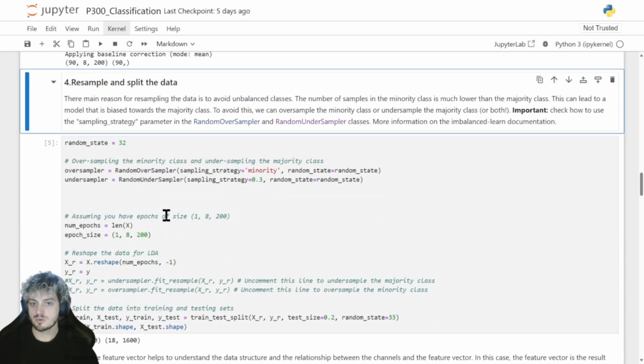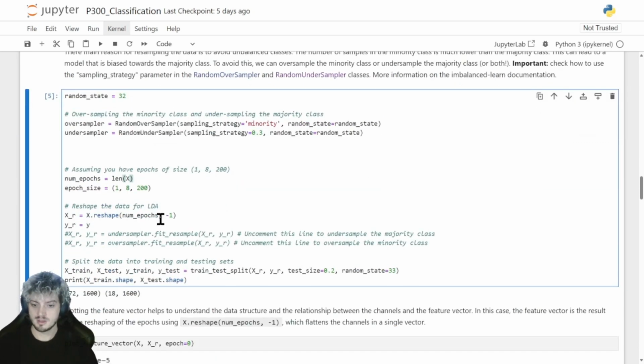We have to do some work with this data. It's an unbalanced problem. First I will show you how to prepare a classifier with the dataset as it is, and then we will see how to improve it by either oversampling or undersampling. I usually pick a test size of 20% of the dataset for standard machine learning.